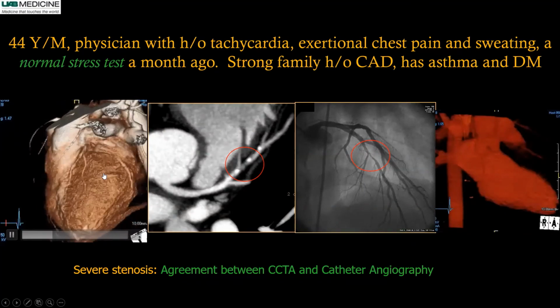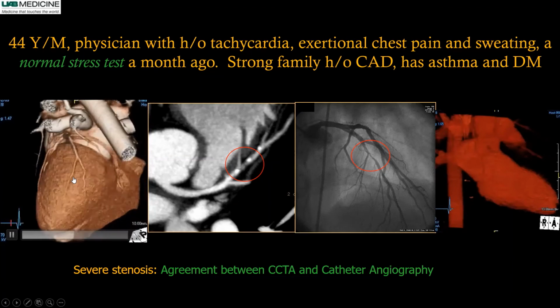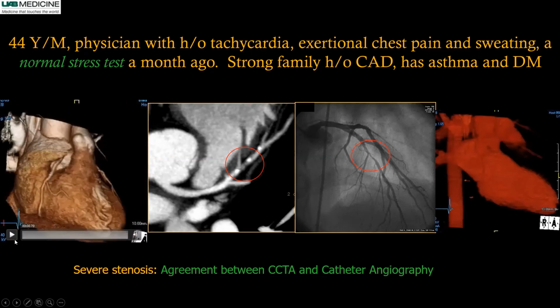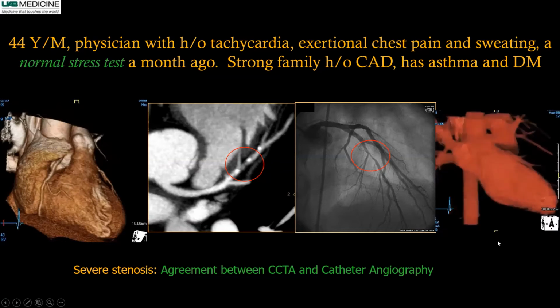And this is again a volume rendered image, which can show the topographic evaluation of the coronary arteries. And you can see even in this case, a tight stenosis of the LAD. So very useful information. And the last thing on this side is what we call CT ventriculogram.